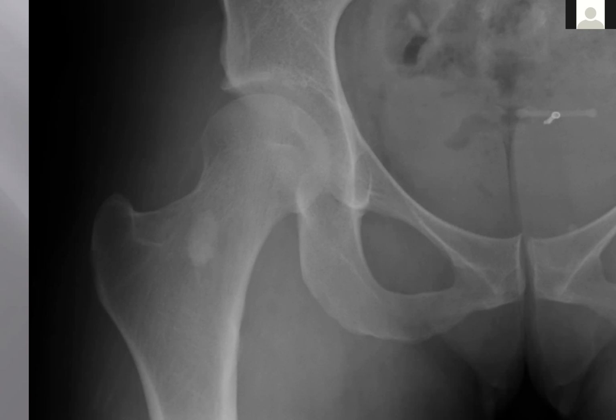Good. I like the periosteal reaction comment, and the reason it's so good is because periosteal reaction is evidence of cortical breakthrough. If you're playing cards, ace is high for a lot of the card games you play, for trumping and all that. And the ace, the finding that is definitive for an aggressive tumor, is cortical breakthrough. If you only had one finding, it would be cortical breakthrough.